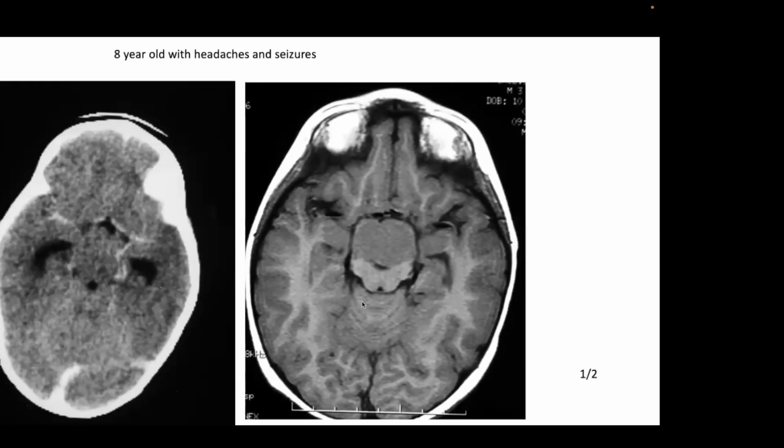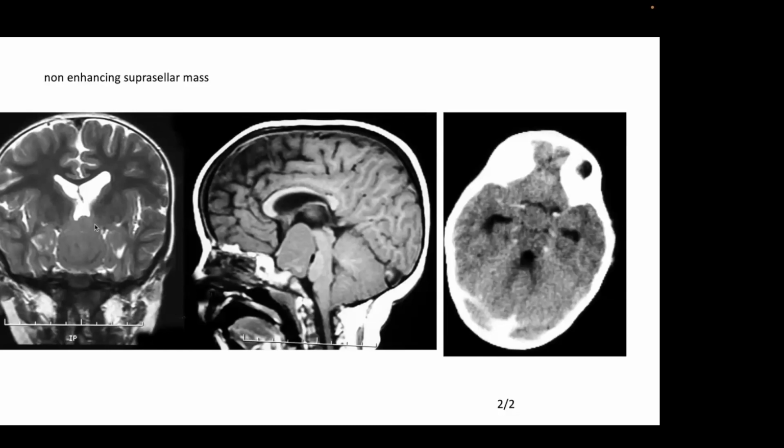I'm going to show you this case just to emphasize that here it's a little bit hard to see, but there's a mass here in the suprasellar cistern. Here you see the A1 segments. This is the pentagonal cistern over the sella. Here you see the mass better on the MR scan with some distortion of the midbrain. This is what it looks like on the T2 weighted scan. You see it looks just like the brain. And this is a particularly large case. This is a hypothalamic hamartoma.